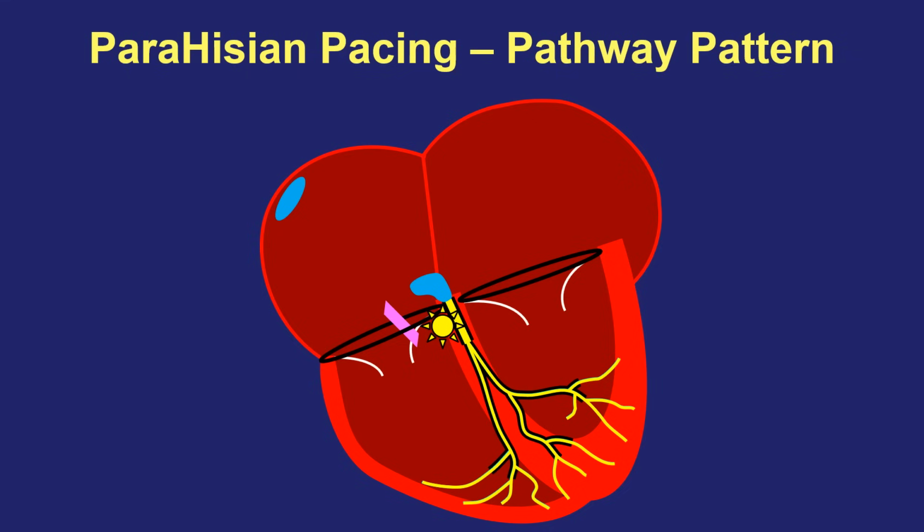But when we capture the ventricular muscle and the His, we are able to get up to the atrium in 2 different ways. We can go up as before, the remainder of the His bundle through the AV node to atrial tissue at this high output pacing, but also we can sneak directly, as this is like an easy pass lane, directly back up to atrial tissue through this accessory pathway.